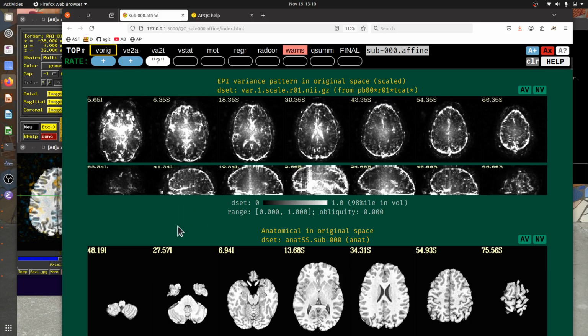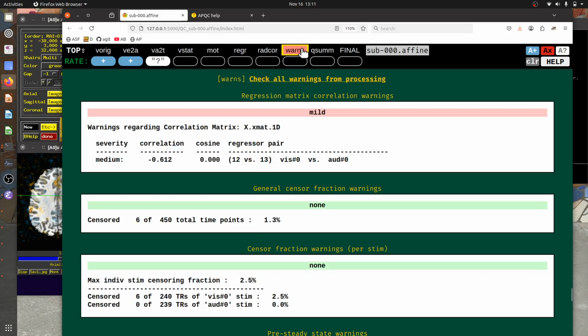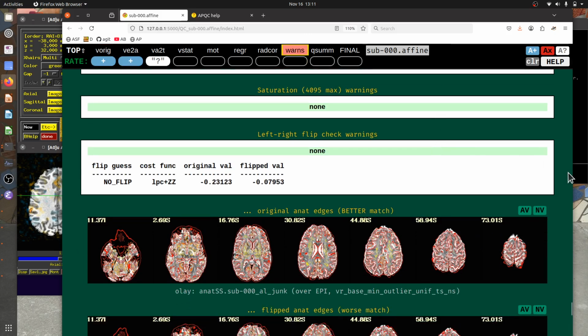You really have to look at your data as you process it. I don't really consider quality control and what we're looking at with our data here different than processing, because it feeds back into your study design, your data acquisition, all sorts of aspects of even other processing choices. You really have to look at your data, look at a lot of the checks that are here, and think skeptically about what might be going wrong. We've really built up this list of checks by finding use for them again and again and again. These aren't just a large number of things that we've put together here.